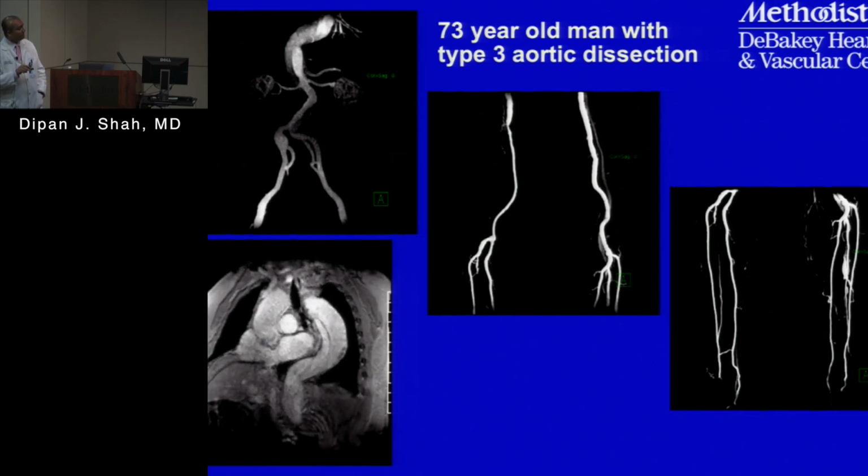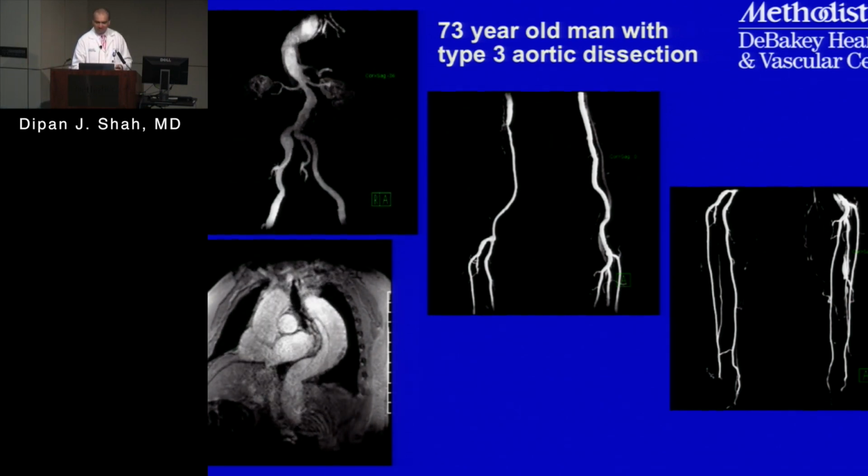If you look at the infrapopliteal vessels, yes, the vessels here are the anterior tibial, peroneal, posterior tibial. So the peroneal is occluded, it looks like, right? But with people with peripheral disease, you're not necessarily going to do anything per se about that. On the other side, though, the peroneal, is there an aneurysm? So you see the origin of the peroneal here. Now this again is outside of the vessel, and this is actually just some venous contamination you're picking up, okay? And the reason I'm showing you this is there's nothing really majorly abnormal on these angiographic images here.